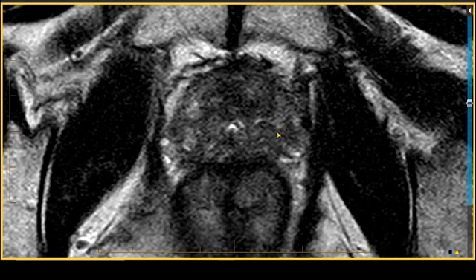Based on the MRI findings, we did an MR-targeted biopsy in bore of this tumor suspicious region, and the biopsy came back Gleason score 3+4, or grade group 2, that's large volume. This completely alters the management of this patient. This goes from somebody that's being managed happily with active surveillance, thinking that they don't have clinically significant prostate cancer, to someone who has pattern 4 disease in their prostate cancer and needs definitive therapy.